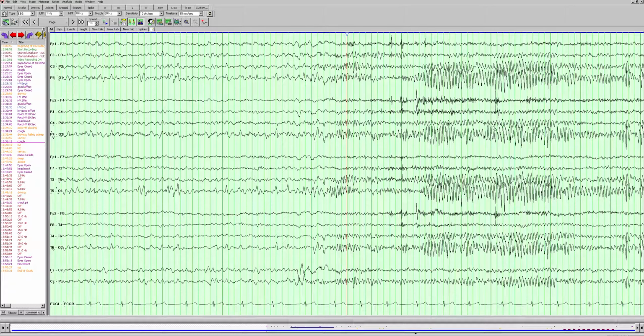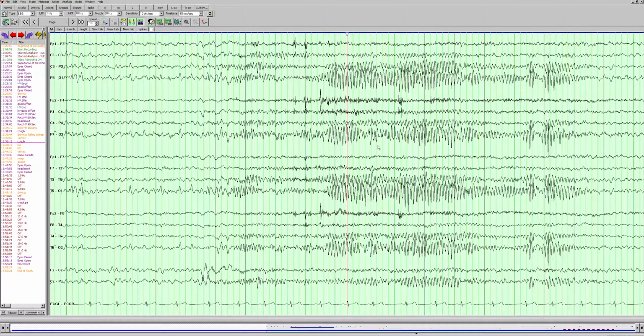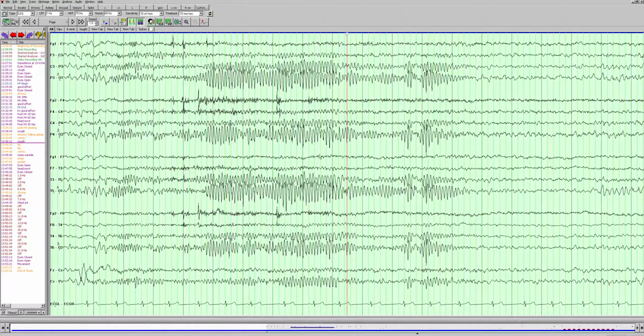I don't want to overwhelm you with too many findings. There are some other interesting findings here. These are called posts, and I'll talk about those more later. I just don't want to overwhelm you with too much at once.